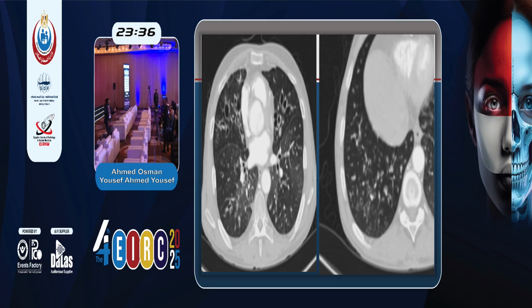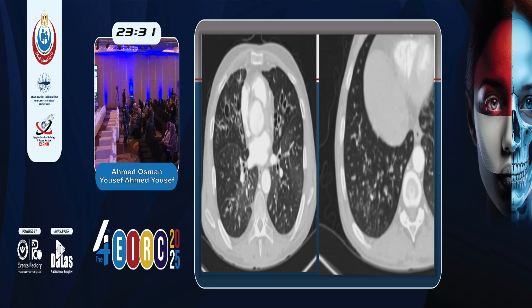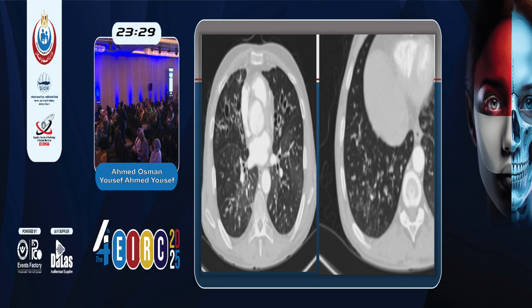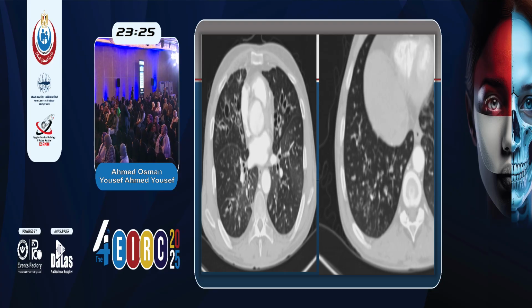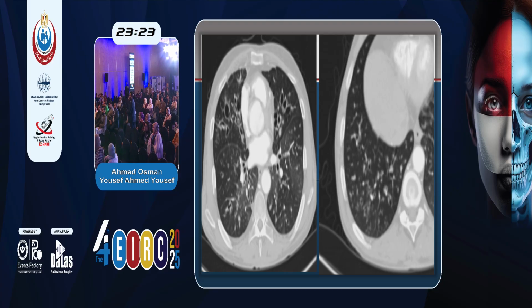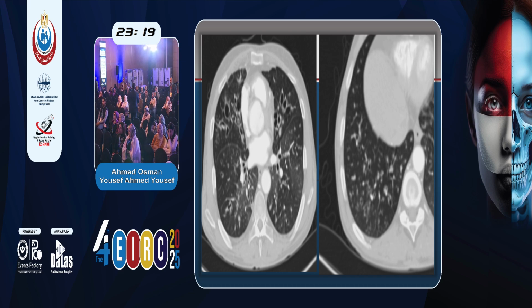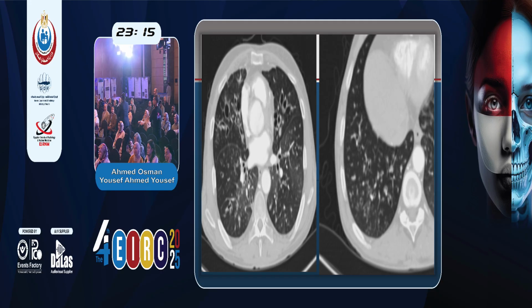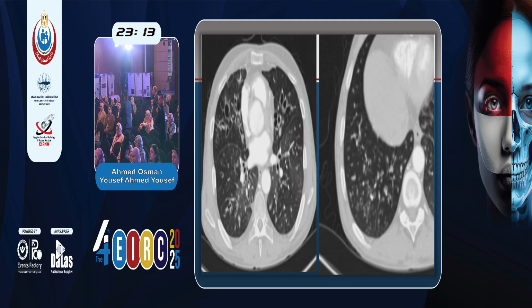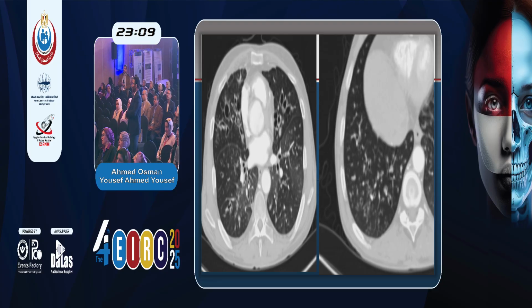It's very easy, nothing tricky. We make a round for all chest diseases today. Yes, bronchiectasis. Okay, there is a bronchiectasis. Nothing else? There are dilated bronchioles, okay? Bronchiectasis, cystic bronchiectasis, involving most of the lungs. Nothing else?